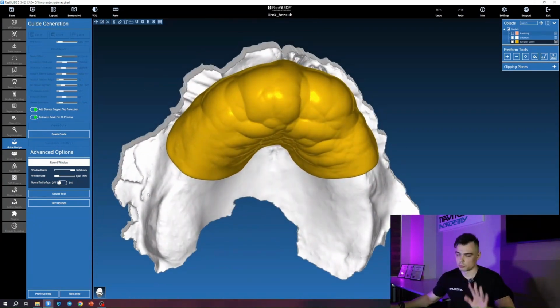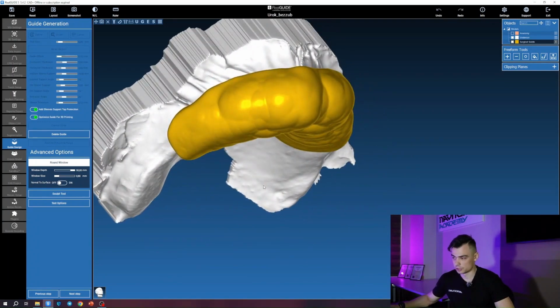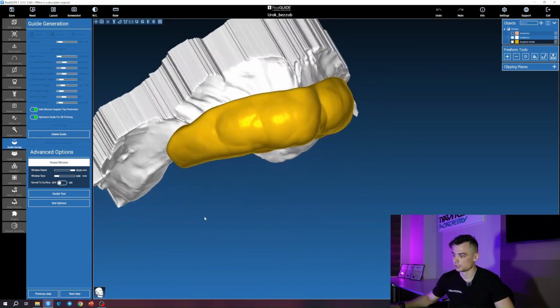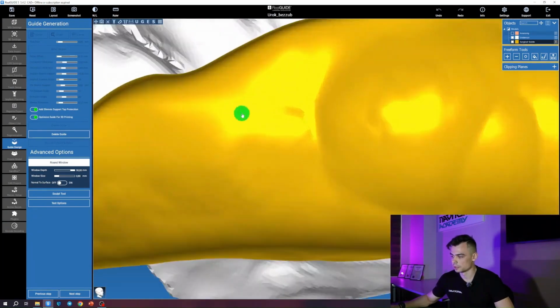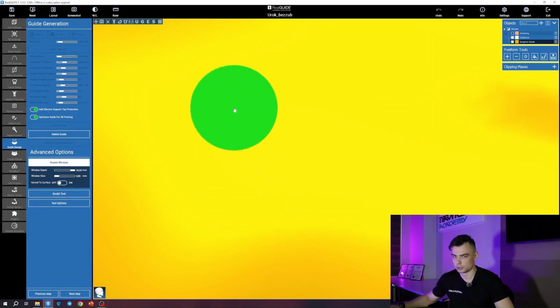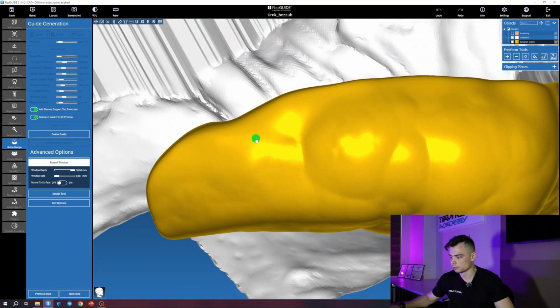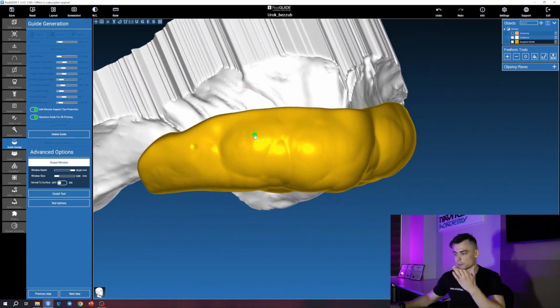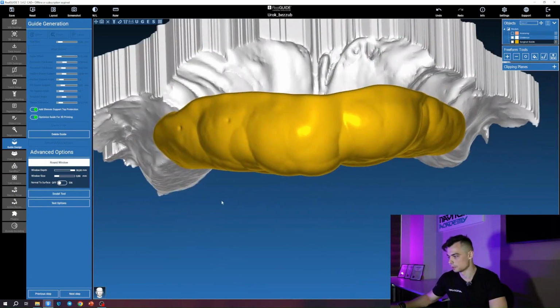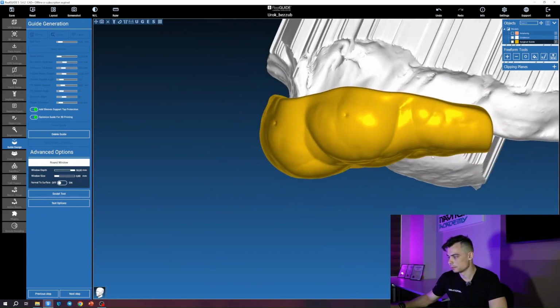Again, for now, just follow along with what I'm doing. Later, after I finish all this, I'll give you some commentary. Position the template like this on the vestibular side. Now we have this green slider appearing at a slight angle, and we press once, then move this area a bit more perpendicular to ourselves. Press twice, again, more perpendicular, 3, 4, and finally 5.